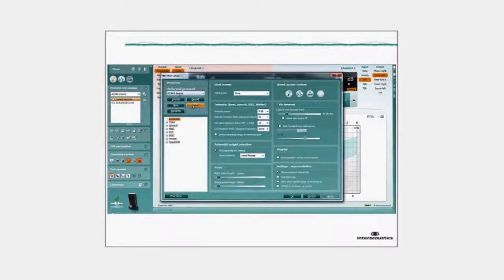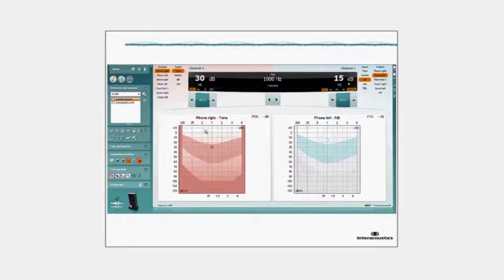So what you can see is as I delete this, it will delete both in the software and in the main setup. However, in the past, it would only delete in the setup and not in the software, needing the user to restart the software in order for the change to be applied.